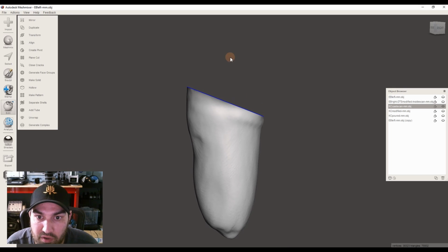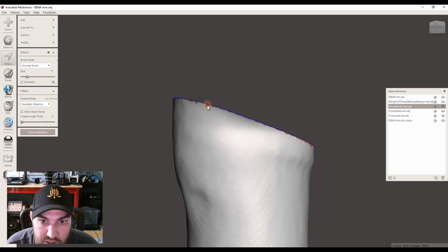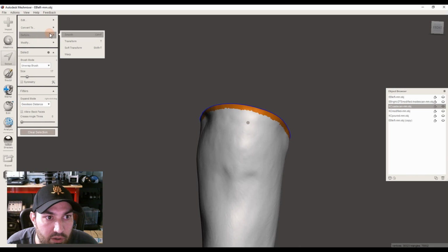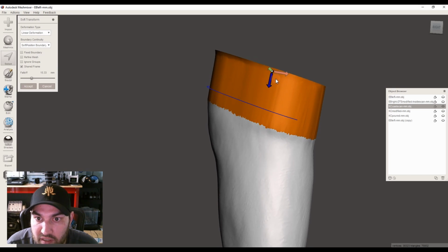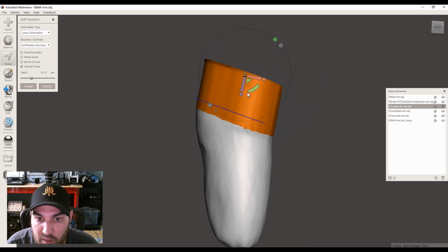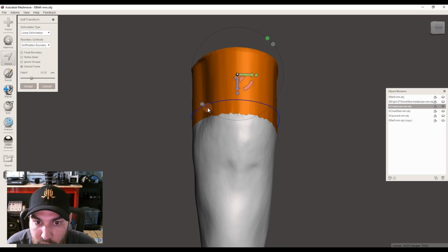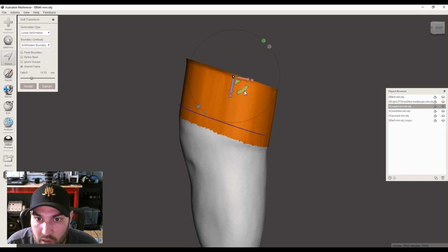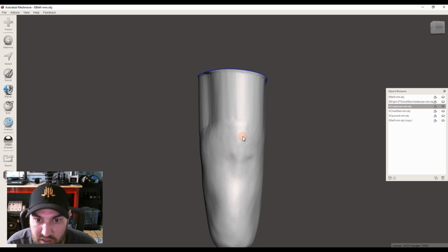If you have this and you need it to be taller to work on it, you can do that edge selection again. Let's actually bring some of that down and then go deform and soft transform. And this is where you can see, if we follow the arrow, it's going to come off almost like we had casted in a little bit of flexion there. And because it's the top of the socket, we might not need any other contours besides what we have. But you could turn that, you could move it if you wanted it to come off more upright.